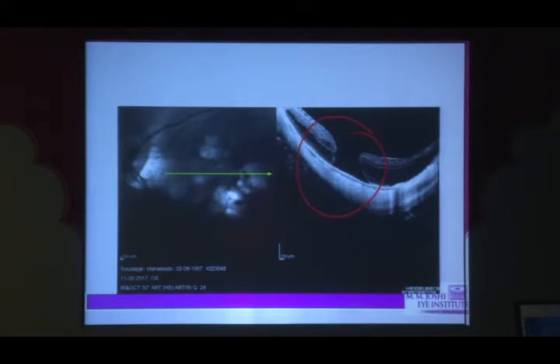So what I mean to tell here is, just with the IDO, definitely you can't examine the macula. For the macula, you definitely need 78 or 90D. But sometimes, even with 78 or 90D, we will not be able to find the real problem. So the examination gets completed only when we have the high-end machines. So this is another case with the 78D lens. We can see the neovascularization of the disc very well.